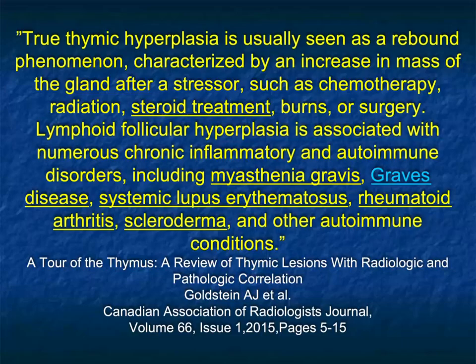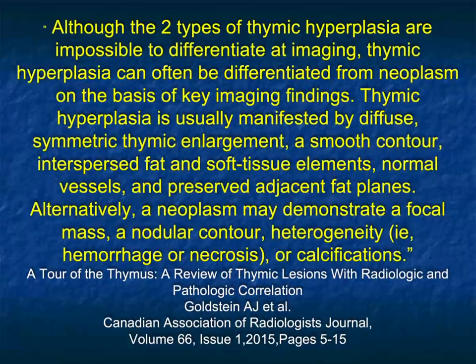And I think when we look at other benign lesions, the one I like to think about most is thymic cysts. Now, I have to admit we don't see very many thymic cysts. We sometimes see small ones, maybe a centimeter in size in the anterior mediastinum, looking like a small node. But you can also have larger ones, which can be challenging.